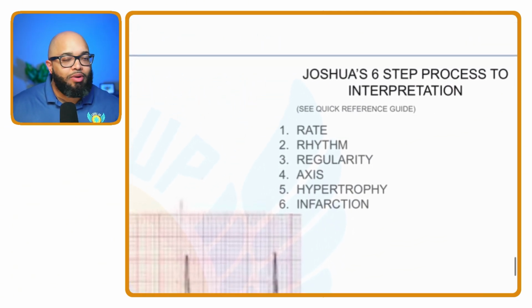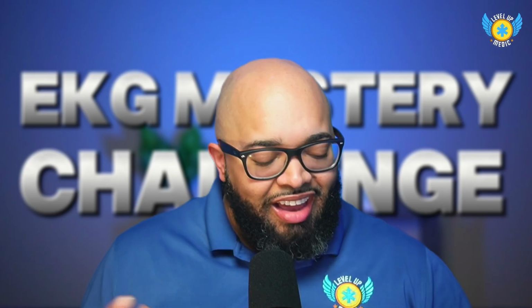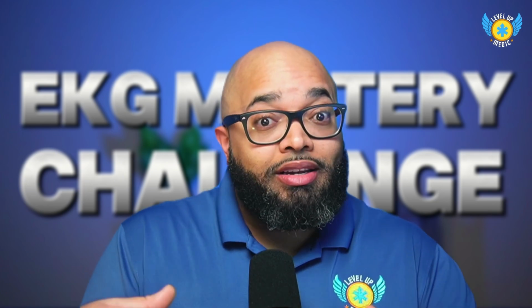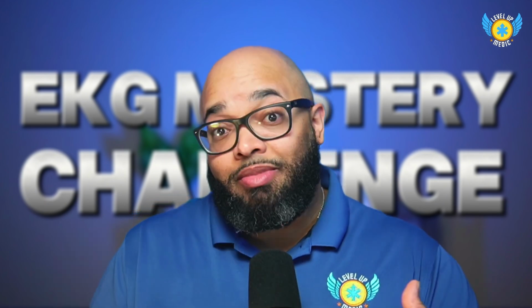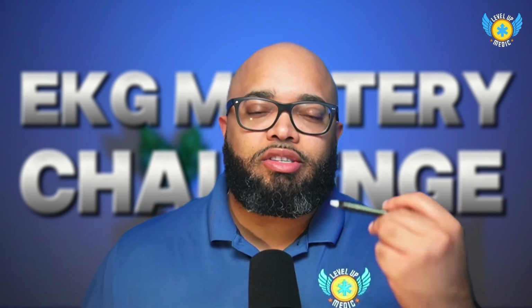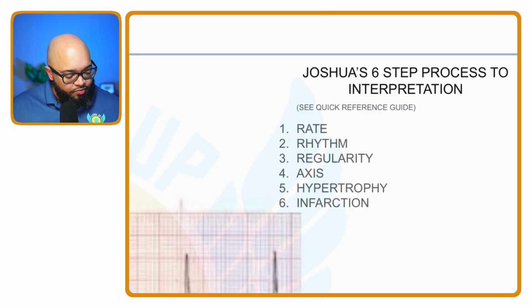Remember the 6-step process that we talked about. There are 6 steps that you're going to use to interpret every EKG. Depending on the quality of the EKG tracing, some things you'll be able to see, some things you won't, but you want to systematically go through every EKG the exact same way. We're always going to start by looking at the rate, okay? Step number 1 is to look at the rate.